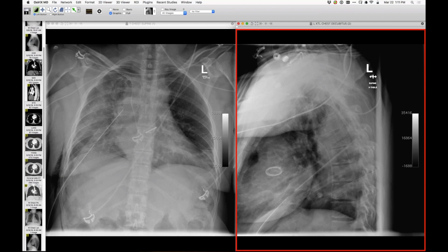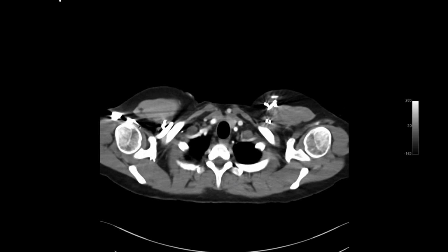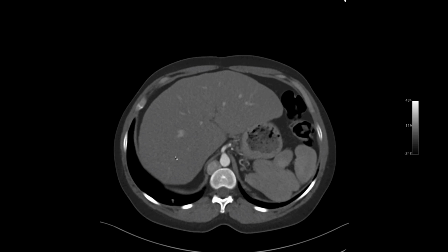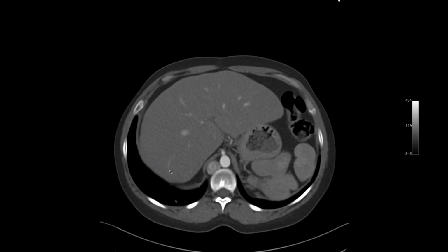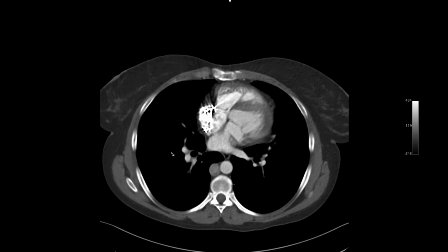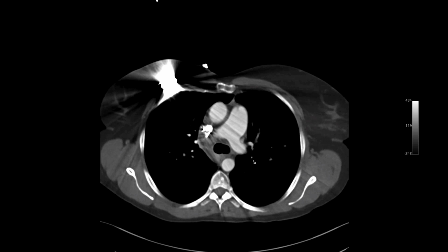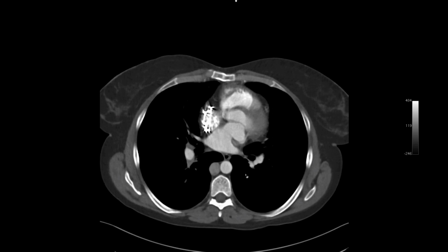So why is it a nice big azygous vein? Now you have to go back and look a little bit more. Analyzing this case, there are a couple of interesting things. There's your big azygous vein. But going into the abdomen, we don't see an IVC in the liver. So there's interruption of the hepatic IVC, and the big azygous vein is carrying more blood flow. And we keep looking because other things come to mind. Here is a little persistent left SVC that goes down to the coronary sinus.